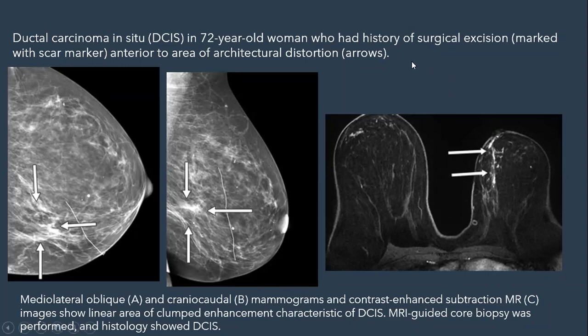The patient had a history of surgical excision marked by the scar marker. You see, this is a scar marker, I think. So this is the area nearby. It's not exactly at the same location, nearby. I have to go further and evaluate it well.